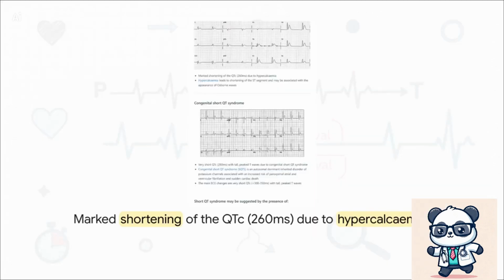Take a really close look at this tracing. See how hypercalcaemia physically shortens the ST segment? It drastically compresses the QTc down to just 260 milliseconds in this patient. That is just remarkably short.